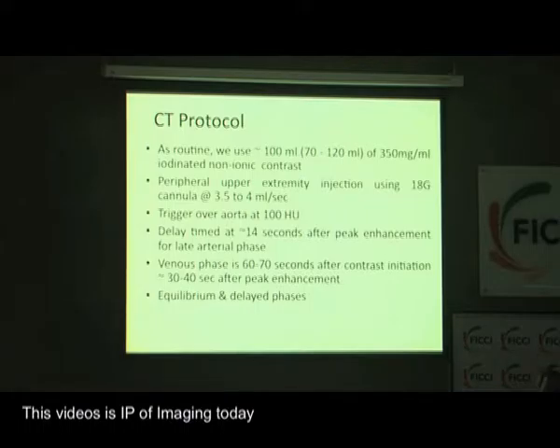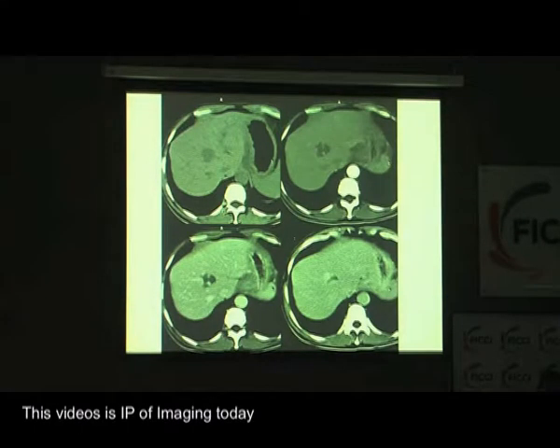Of course, the venous phase is approximately a minute after contrast injection, and then you can take the delayed phases afterwards. So this is a typical example of a hemangioma, demonstrated previously by Karthik as well.